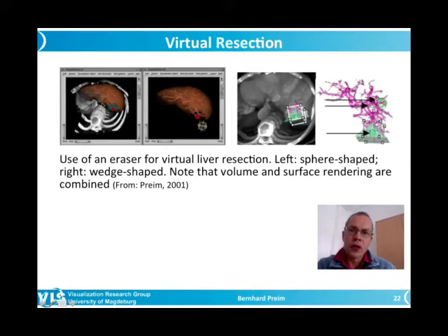The two visualizations here are similar. It's the same viewing direction, but here you see that the skeletal structures are also shown to provide more context and to help to better interpret this situation. That was the view that was actually used by the surgeon in order to resect something. He just placed the resection tool away from the liver, not to hide something. These are the interaction facilities to change the viewing direction. So that was adjusted with one hand, and the other hand moved this tool.